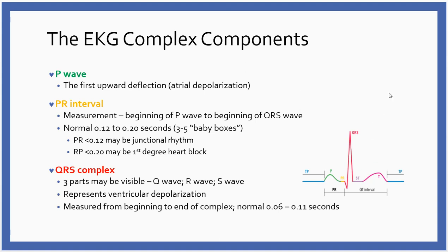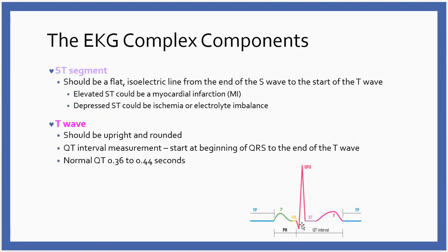Okay, from there, the next thing I'm going to look at is what's called the ST segment. Now, the ST segment isn't a waveform. The ST segment is the period of time between ventricular depolarization and ventricular repolarization.